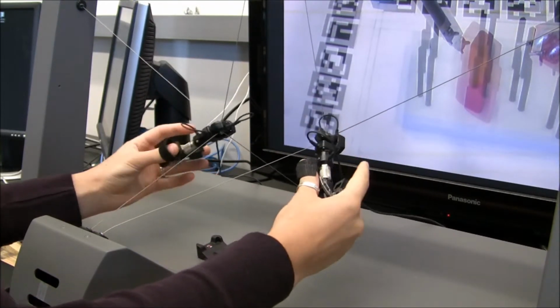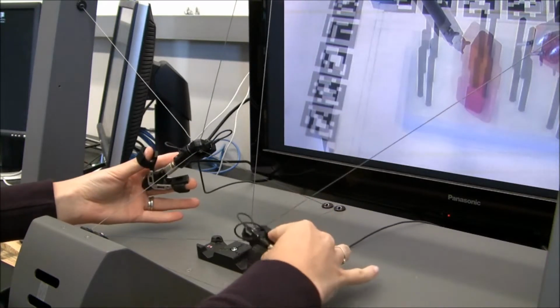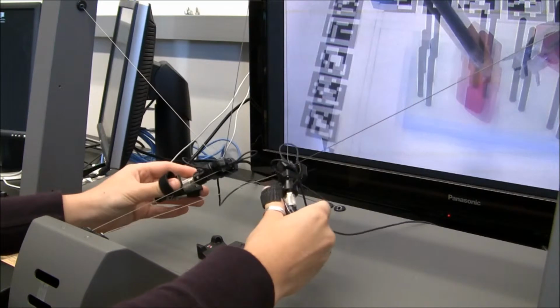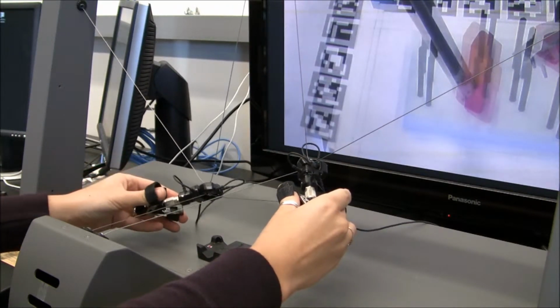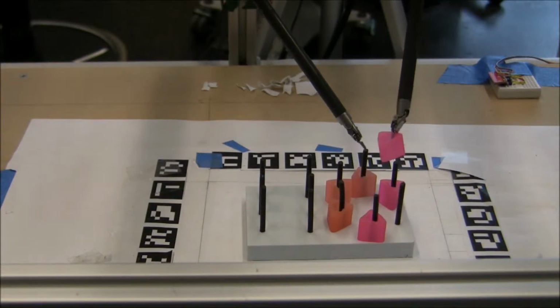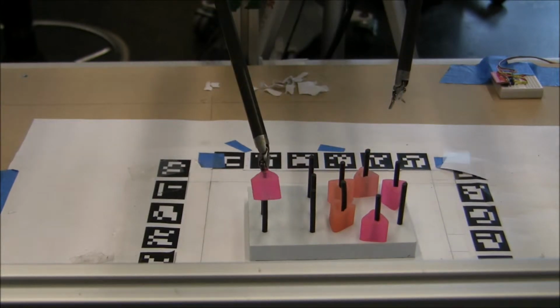Prior to utilizing the master console, the surgeon must calibrate the instruments. To do this, the user must press the surgical handle downward onto the red calibration button until they hear it buzz twice. Once calibrated, the instruments are ready to use. The surgeon operates the instruments with slow, deliberative movements, and the robotic instruments mimic his or her movements.